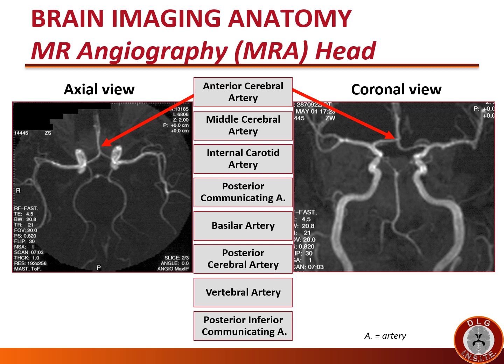The arrows on this slide point to the anterior cerebral arteries. We clearly see the middle cerebral arteries in both views on this slide. The arrows on this slide are pointing to the internal carotid arteries in the cavernous or siphon portion in which the carotid artery, internal carotid artery, has an S shape.